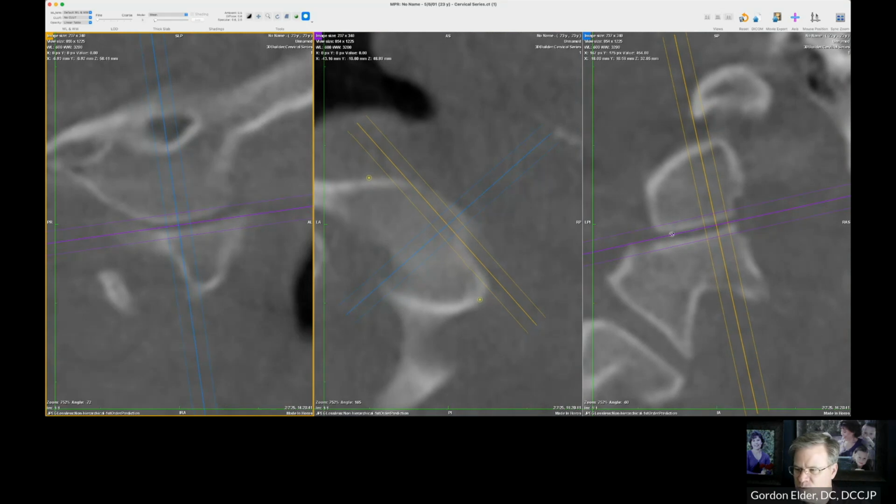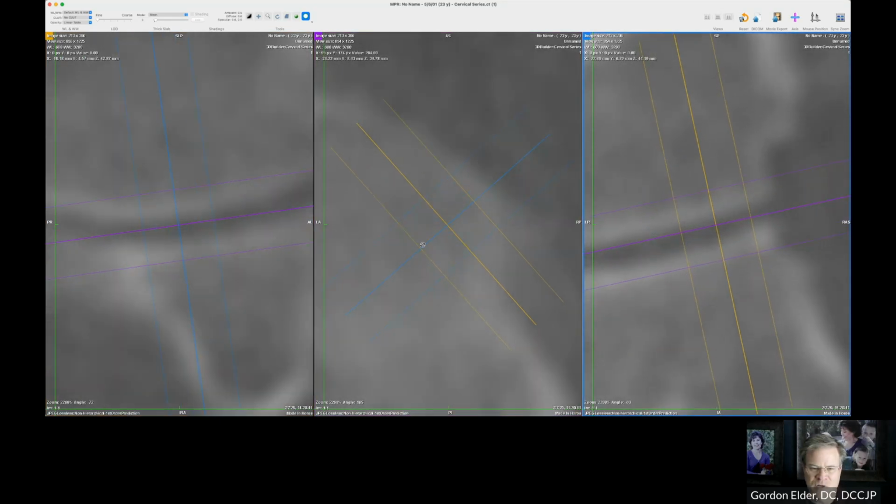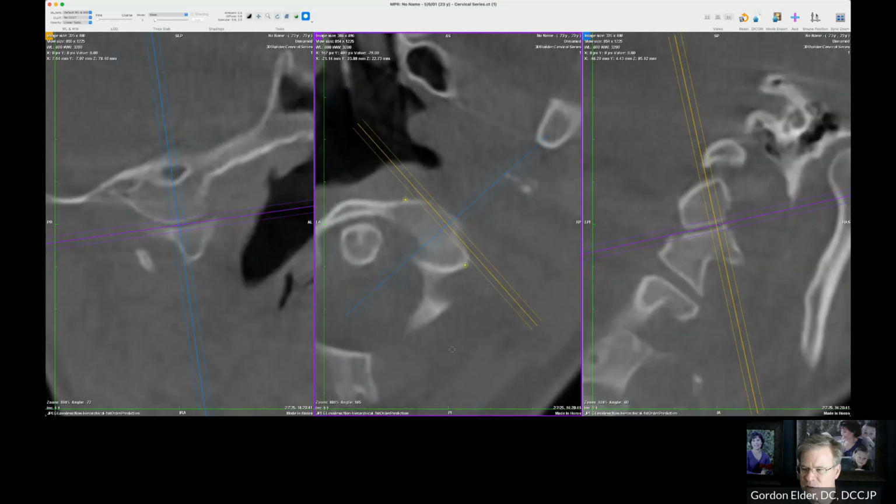But this really, I mean, it's so obvious that she was anterior, superior, and left, the big overlap on the other side, that if there is a posterior, inferior, and left, it's pretty small. And if you really start looking at things, you're always going to find stuff that probably isn't there realistically.